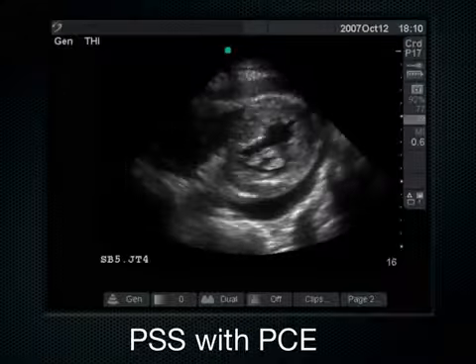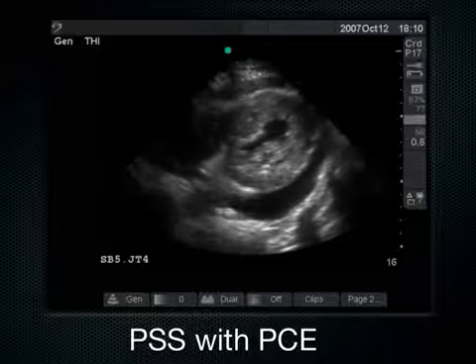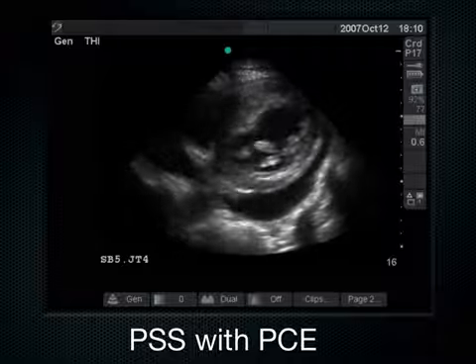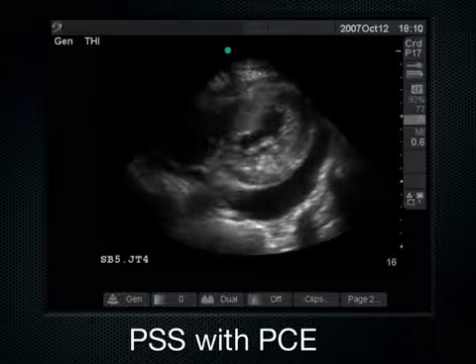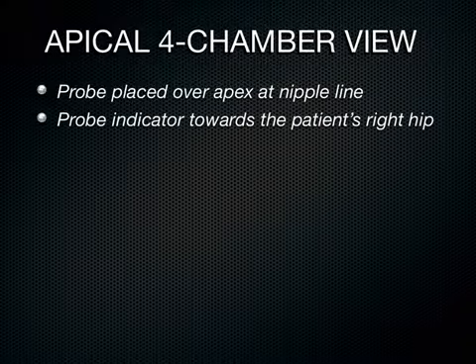This is an example here of what it looks like when you've got a pericardial effusion in the parasternal short axis. Of the four views of the heart, this is probably the one I use the least amount to do my work. However, just pointing it out for the sake of being complete. However, the apical four-chamber is quite good for comparing chamber sizes.